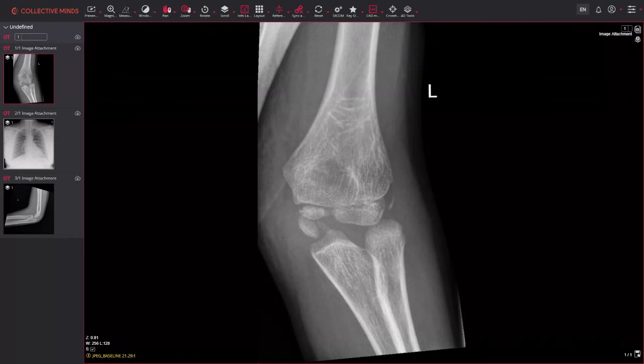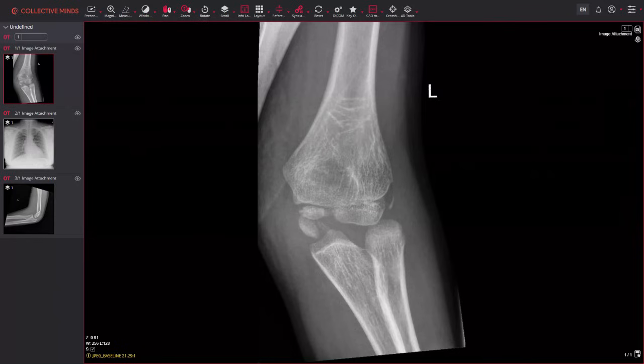Personally, I like to refer to the degree of displacement as minimal, mild, and significant. Moderate, I don't tend to use because it's neither here nor there. What does that mean? I got told off once by a radiologist, so I've never recovered. So I usually just go minimal, mild and significant.